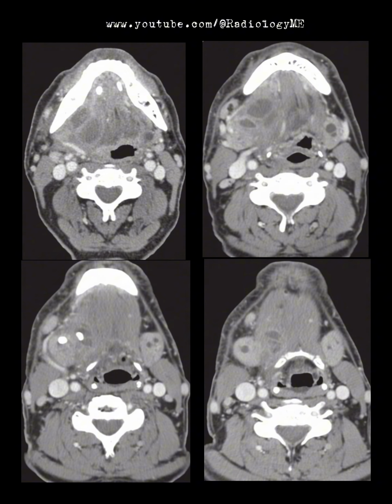Given these findings, I would immediately discuss this with the ENT surgical team as an emergency, due to the risk of serious complications such as airway compromise from the abscess spreading into other neck spaces. There's always a significant mortality risk with submandibular space abscesses, especially with the degree of infection and obstruction shown here.